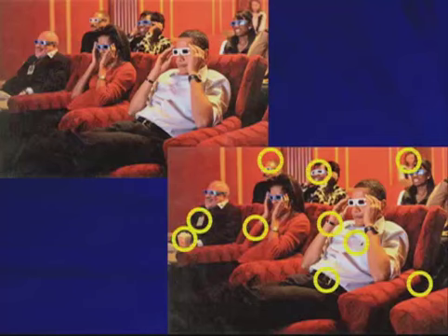So just like these pictures, as imagers, we pride ourselves on being able to spot differences in pictures, but sometimes the picture differences are very subtle. And so it's important as we go through our daily life and we see numerous pictures of the kidney that we look very carefully, as in these pictures, to spot any discrepancies that might give us a hint that something is wrong.